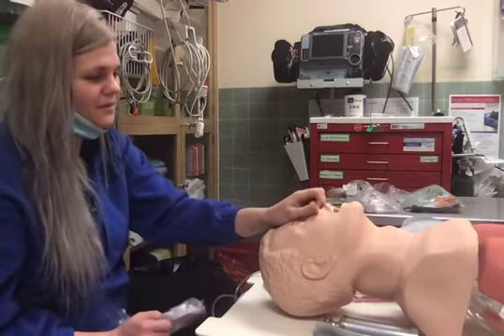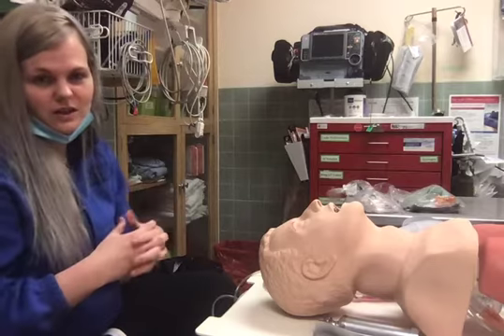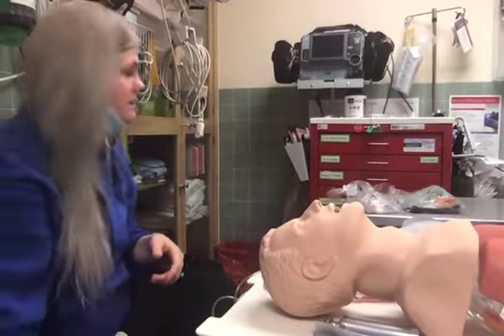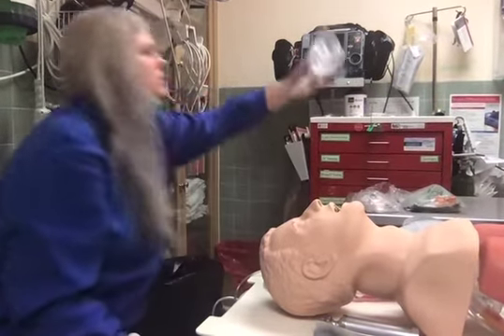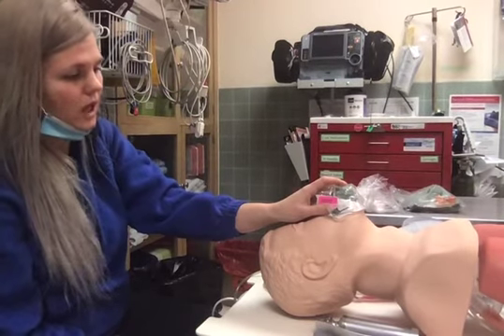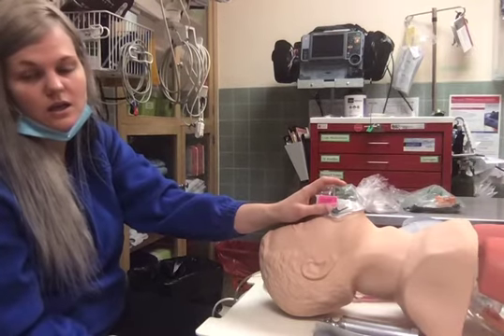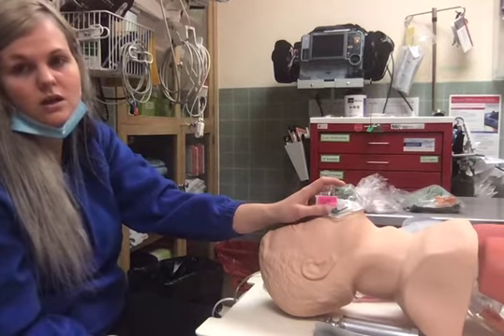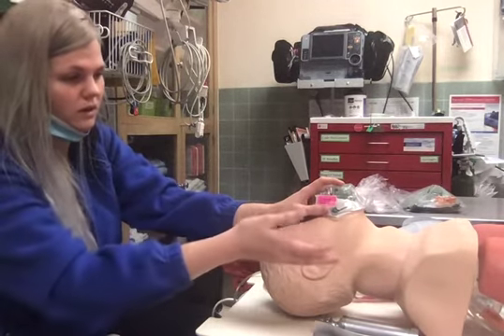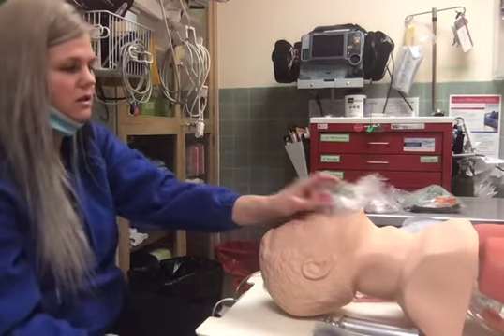As you move through the oxygen therapies, you want to consider, again, what do you have and what do you need? Next step, you're going to be utilizing your simple mask. This is just going to increase your FiO2, same type of idea as your nasal cannula. This is just going to increase the ambient oxygen in the environment, so the oxygen will be available when the oxygen CO2 exchange happens in the lungs.